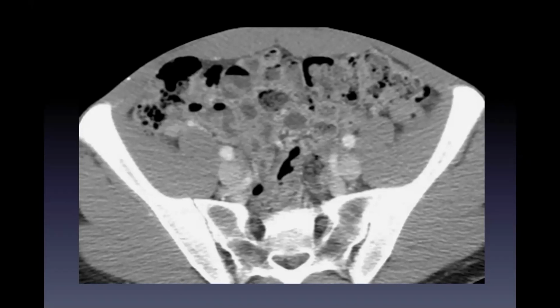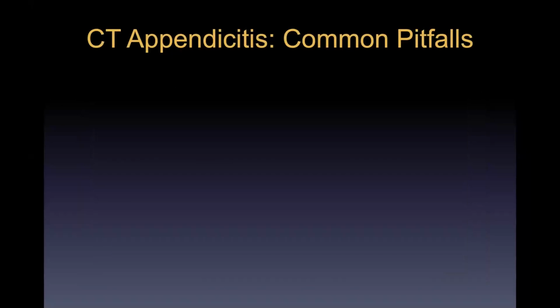So what that means is if you do have a patient that has a good amount of intra-abdominal fat, if you can see fat around the cecum and you still don't see the appendix and you still don't see any evidence of inflammation, the likelihood of appendicitis is even lower than 2%. So really, we miss it 2% of the time, even when we can see it clearly, we don't always call it accurately. So you can really consider this a negative CT result and move on. And the surgeons are familiar with that statistic.